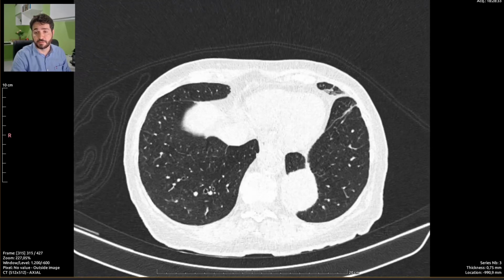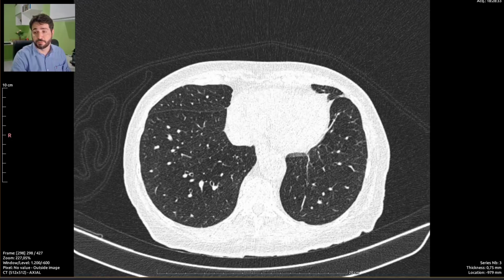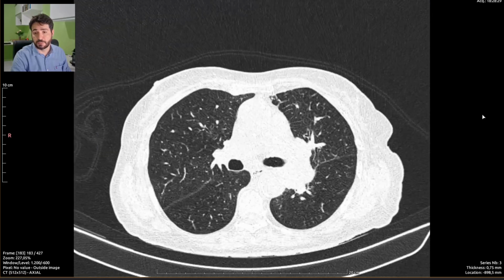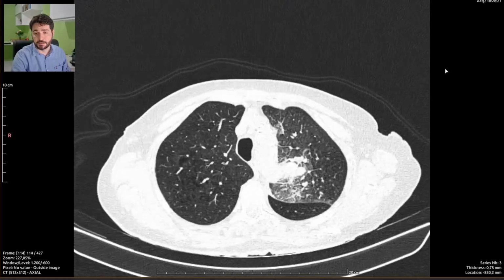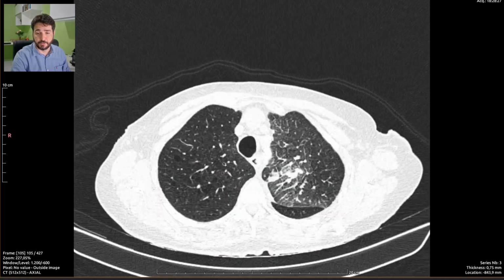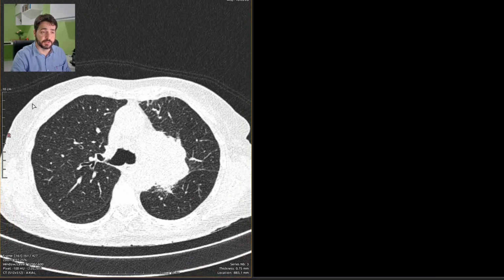This is scar tissue, and it's also really common on the medial segment of the middle lobe, and of course on the inferior segment of the lingula. So this is what it is. No pleural effusion. So I have right here a pulmonary mass on the superior left lobe. It is a solid mass because it has soft tissue attenuation, so it's solid.